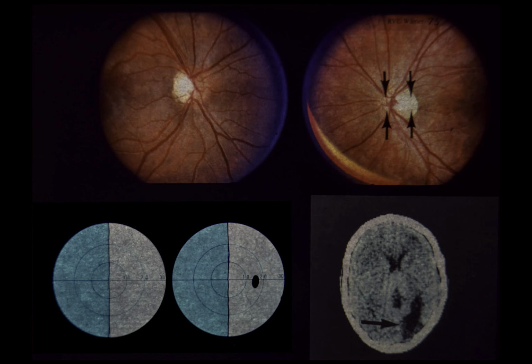Slide 75. Hemianopic atrophy from transsynaptic degeneration. Shortly after birth, this 9-year-old male sustained an occipital intracerebral hematoma. 5 years later, he was noted to have bilateral optic atrophy and visual field defects. Visual acuity was 20/20 OU.